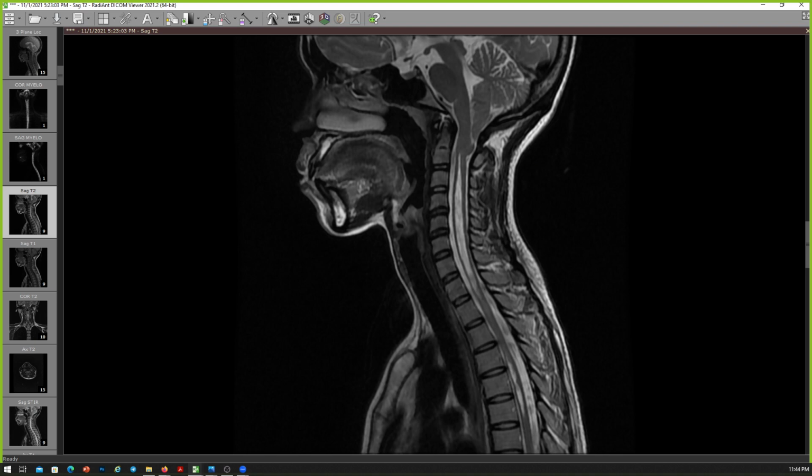No, I'm not sure. So what are the types of Chiari malformations that you know of? Chiari-2. Yeah, so what do you see in that? I see a Z-shaped brainstem with elongation of the fourth ventricle, agenesis of the corpus callosum, and the meningomyelocele, hydrocephalus, and beaking of the cerebellum. Okay, good.